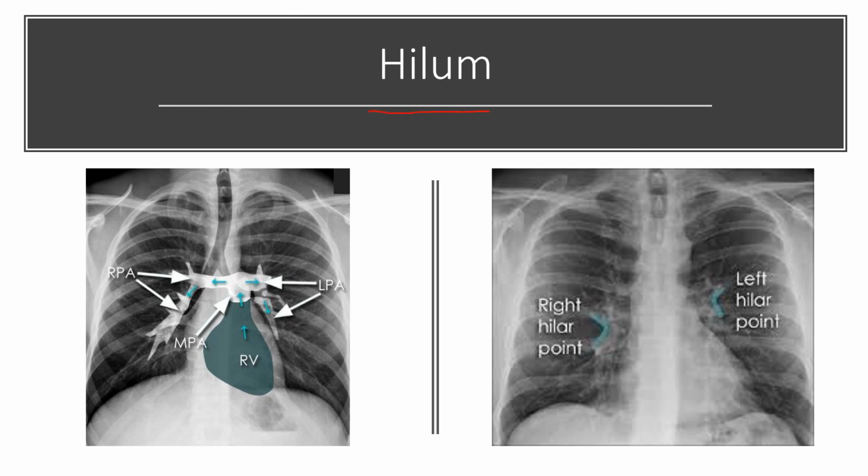H is the hilar area, and so that's what we're looking at here. So that right hilar point and that left hilar point here. So this is the area that sort of surrounds that central part of the x-ray. So here you're looking at the pulmonary artery. And so if someone had a saddle pulmonary embolus, where there's a giant blood clot that's just sort of developing right there, then you're going to see accentuated markings. You're going to see a lot of markings in the central area.